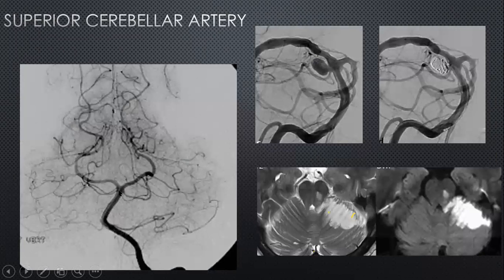Reaching up to the superior cerebellar artery, which is just below the basilar termination. So you have got the basilar termination with the PCA, and these again are very variable. Sometimes they can be duplicated, for example, over here. Sometimes they can share a common origin with the PCA, or occasionally they can be seen as separate arteries by themselves. They are prone to aneurysms because of this disposition.